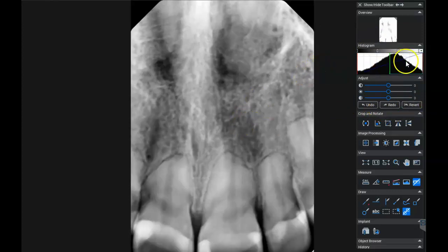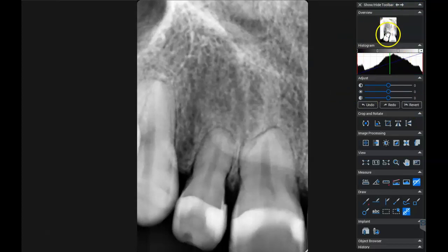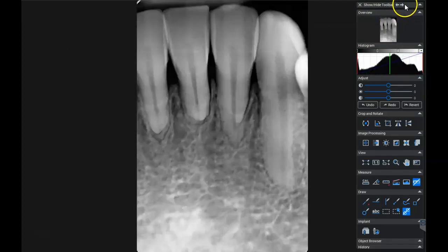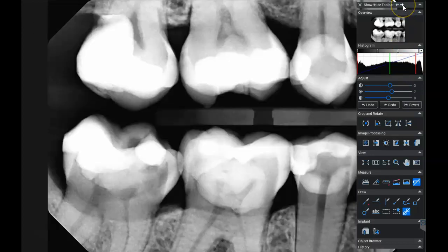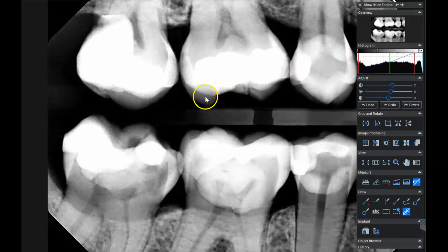So that is a completely exaggerated, unpredictable use of being able to change the resolution, because you never know what you get, especially in a situation where the image is large enough that the toolbar covers the image. For instance, like on this one, if I wanted to change it, and as we can see, I tried to change it, but as soon as I hit my right mouse button, it jumped back to that interior image.